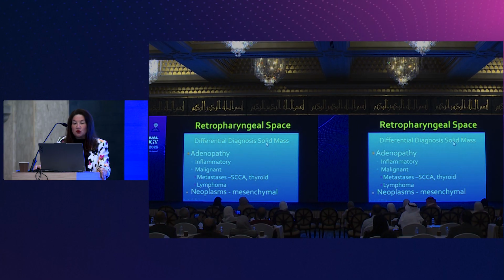And the differential diagnosis of a solid mass in the retropharynx: adenopathy, inflammatory, which may go on to an abscess, we've just seen that, and malignant.